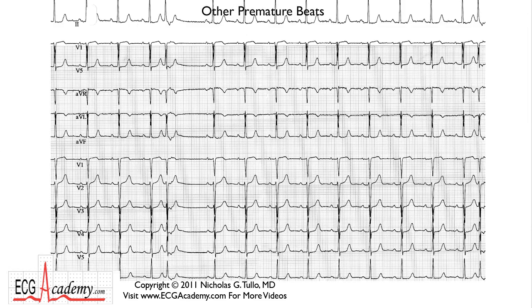Now here's a 12 lead. It's kind of set up differently because you've got all the leads kind of like, it's almost like a rhythm strip.